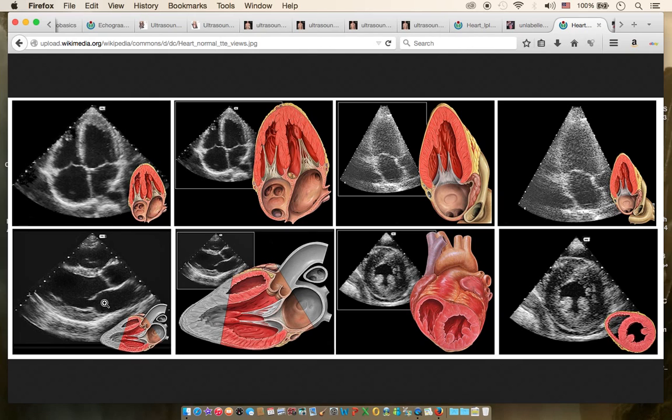And one thing I will mention here is that in the videos, the mitral valve opens 2 times, not 1 time. So it opens 2 times, because during systole the blood fills the left atrium, and during diastole the mitral valve opens, and a large amount of the blood in the left atrium goes to the left ventricle passively, that means without contraction.